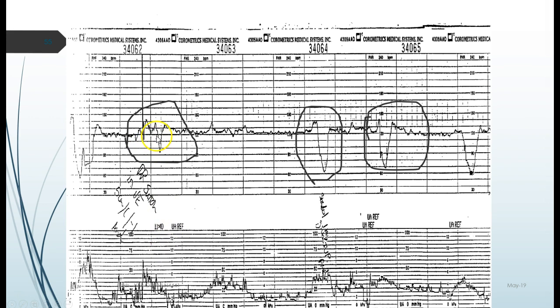So here's some pictures of some variables. There's probably some accels. There's a big whopping variable. So we would document this one. This one dropped down into the 60s, sorry. And so here's some variables. This dropped down to, looks like maybe 110. No, that's 50, 60, 70. I can't read those numbers. Okay. And so we're going to document these. These are happening with the contractions.